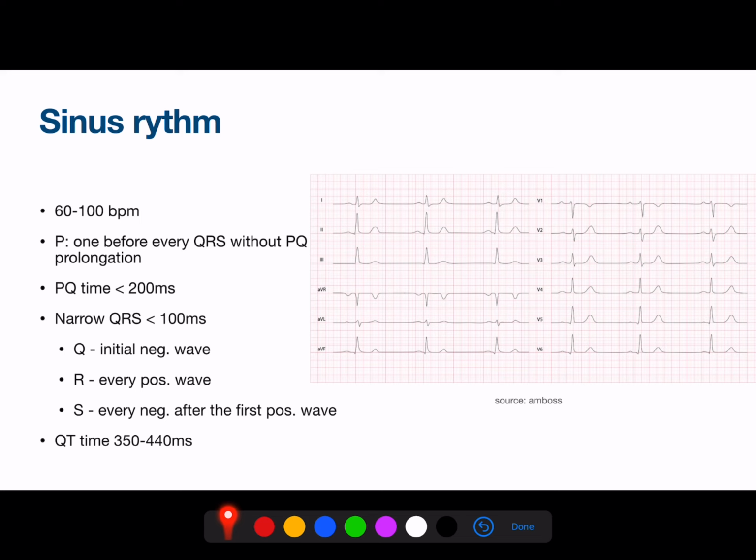As you can see maybe in this ECG as well, not every lead there's always the QRS, but maybe just some of them, which is not a problem, but you just have to know that when you describe an ECG, that, for example, in this case, there's no initial Q, so this is only R and S. That's no problem, but just to understand it, for some pathologies you have to know it.